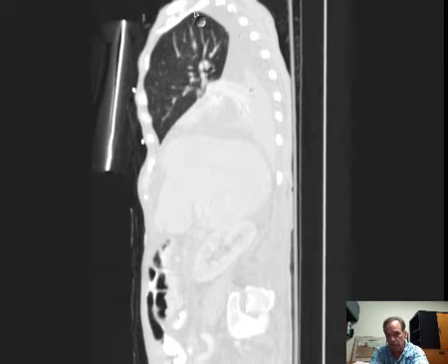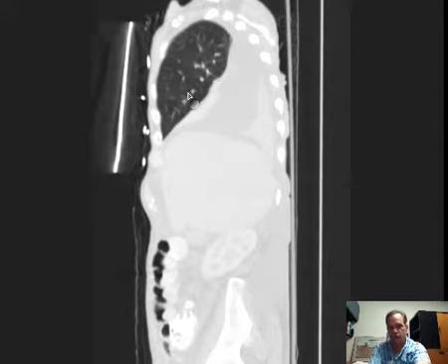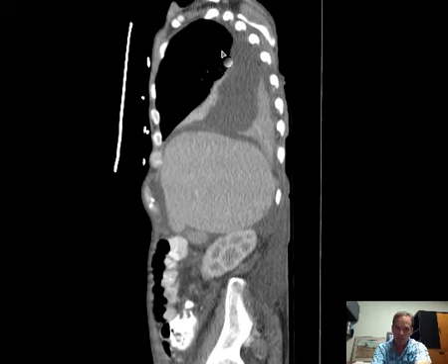So I think that the volume loss we have in the right upper lobe is relatively mild, and it's not really creating a compressive atelectasis. What it's really doing is just impressing upon the right upper lobe in this area, and therefore diminishing the overall volume in the right upper lobe, but not actually creating that atelectatic flattened appearance of the right upper lobe.